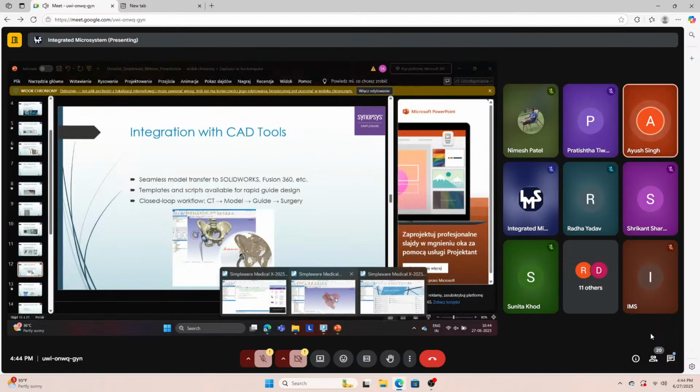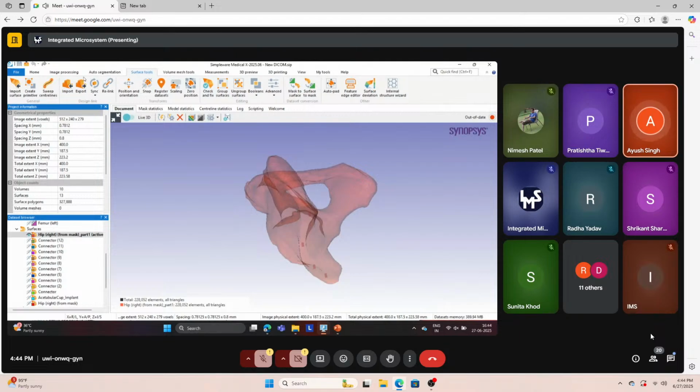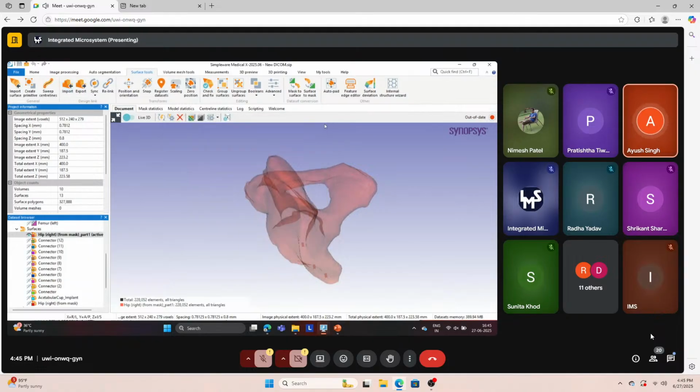And we also have a direct link up with SolidWorks. So if we have an active license of SolidWorks, here you can see we have a design link model. We will be linking in the current system that I'm using. I don't have an active license of SolidWorks, but just how the particular tool works is we will be linking up SolidWorks with Simpleware. Later on, the particular file can be brought in in any of the formats, SLD part or SLD ASM.